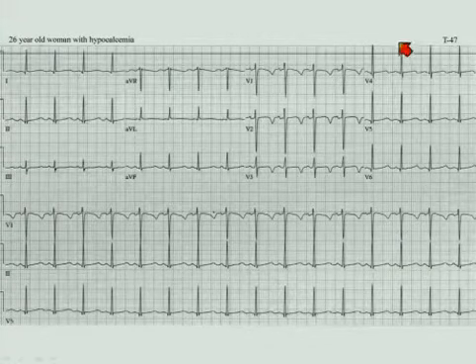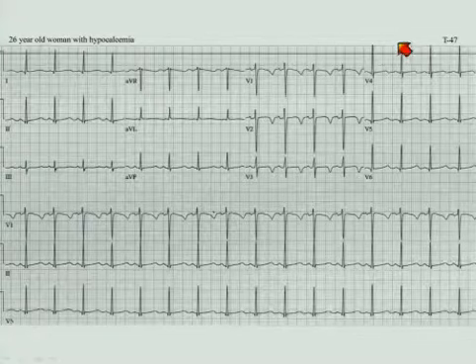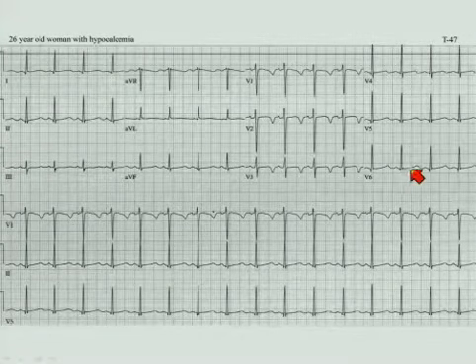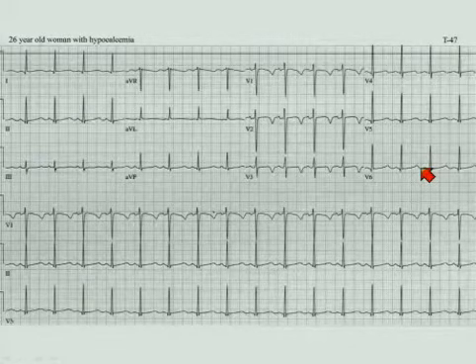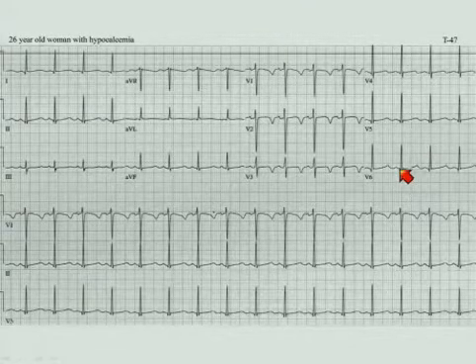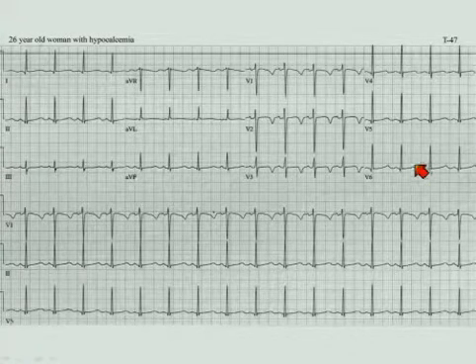This is a patient with hypocalcemia. You'll notice that there is prolongation of the QT interval, but it's an unusual kind of prolongation in that it's all in the ST segment. There's nothing wrong with the T wave here in terms of its duration.